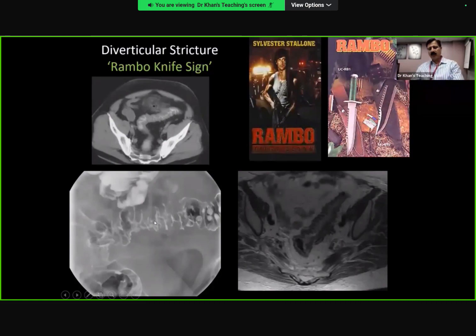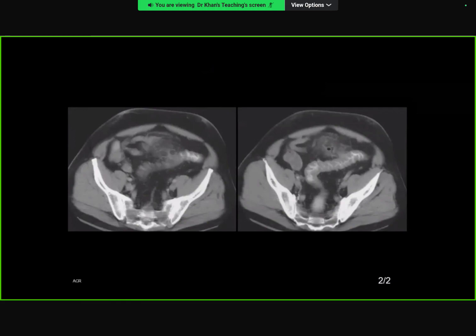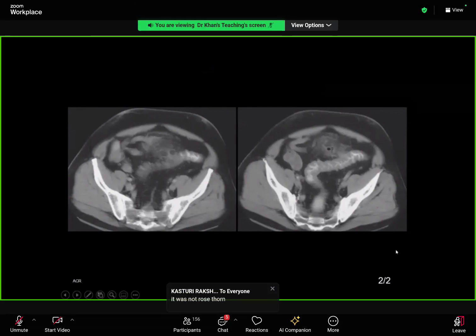Now, candidate 2, can you please tell me how are you going to handle this part of the findings, and what is your diagnosis for this part? Yeah. So there's a mucosal edema, there's serrated outline of the muscular mucosa of the sigmoid colon. There's adjacent mesenteric inflammation, and I can see an extraluminal gas locule centered in that mesenteric fat stranding.